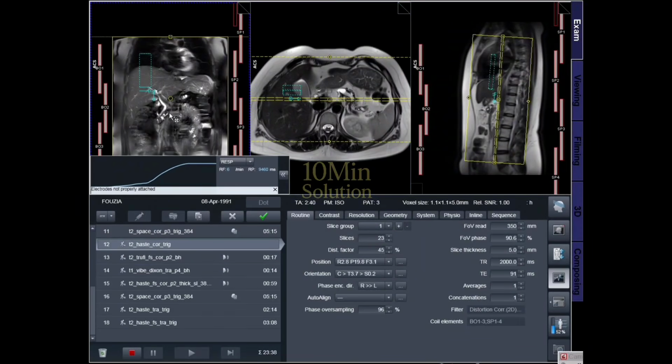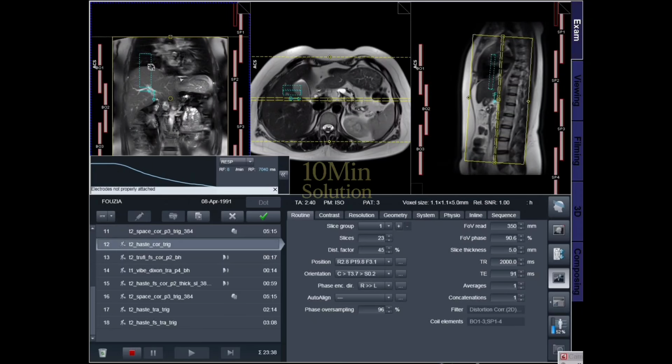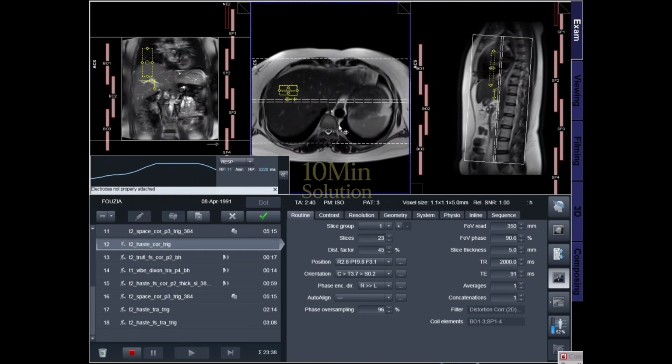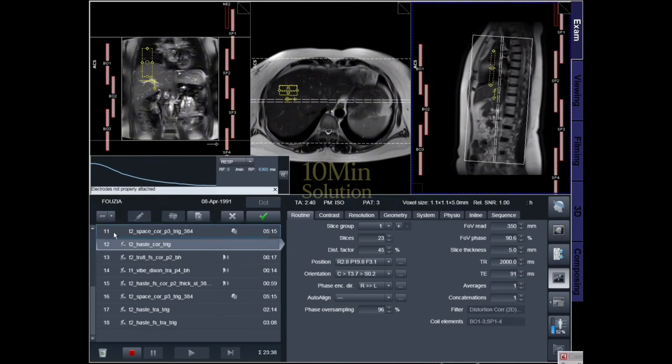Today I will discuss with you a very important topic: MRI of MRCP. MRCP means magnetic resonance cholangiopancreatography. So let's get started. First of all, you can see here the three images. The first image is coronal, this is axial, and another is sagittal.